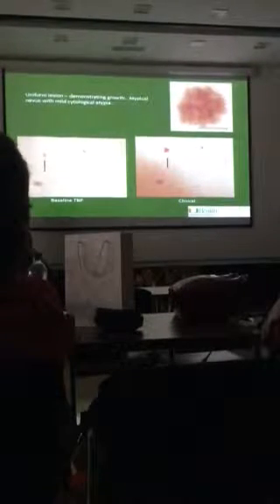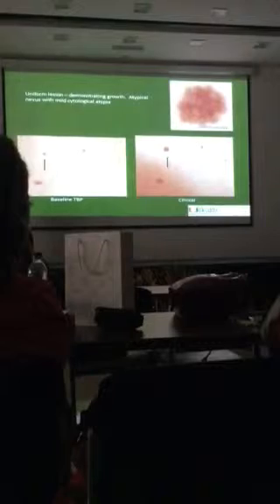Examples of growing nevi that were in fact just nevi, very uniform type of lesions with relatively benign dermoscopic features. So again, what we're looking for is what's unusual for that patient. Something that just doesn't match their others, a spot that maybe they're focused on, and that's growing. In those scenarios, you really do need to pay attention, because that's probably where the real early melanomas are. As they become non-uniform, they're becoming more and more advanced.